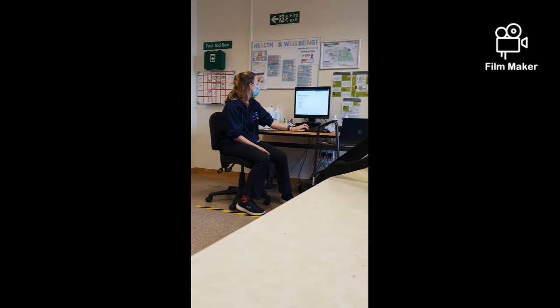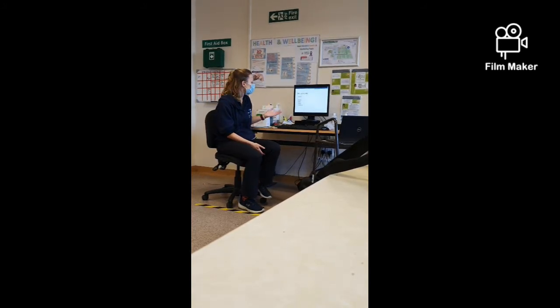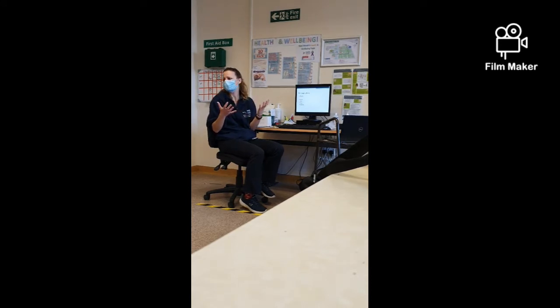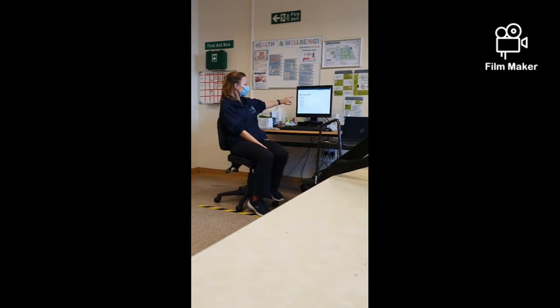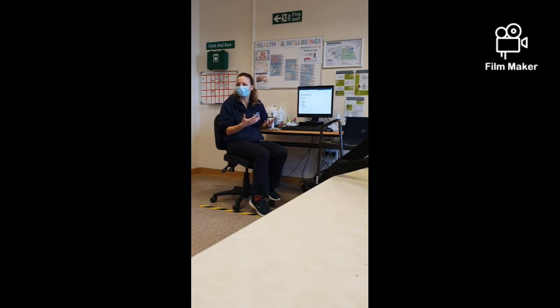So, first things first, when we're looking at chest X-rays, we need to make sure we've got the right chest X-ray for the right person, the right date. With the systems we use in hospital at the moment, someone could have 6, 7, 8, 20 different chest X-rays, and it's very easy to mix up or not look at the right one. So we need to check the name on the chest X-ray, the date it was performed, and the time. If we've got patients that are deteriorating on the ward, they could have had 2 or 3 chest X-rays in the space of 48 hours, so we need to make sure we've got the most up-to-date one.